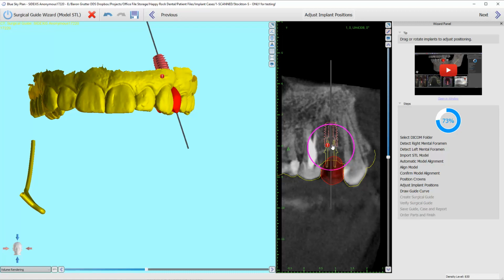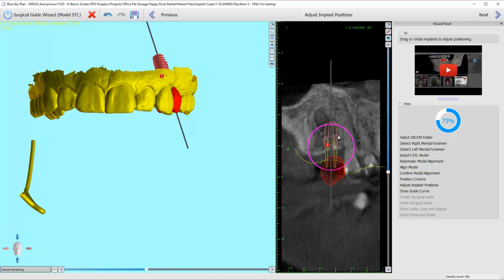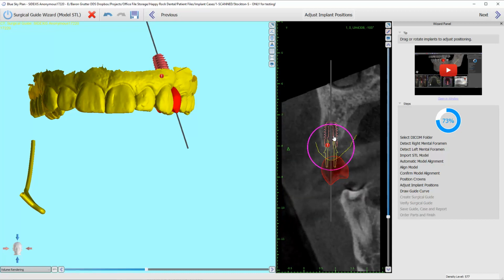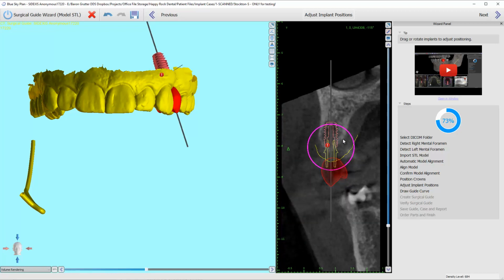I'd like to be here, nice below the bone. The margin of my abutment, my tie base, is above the bone. I'm pretty well centered in here. Yeah, now I'm pretty much centered. I'm pretty parallel to the contacts. I like that. But now I've got to rotate around and see whether that's doable buccolingually. It's pretty darn close. I'm probably going to have to go a little bit deeper and end up using a slightly taller tie base abutment, but we're getting there.